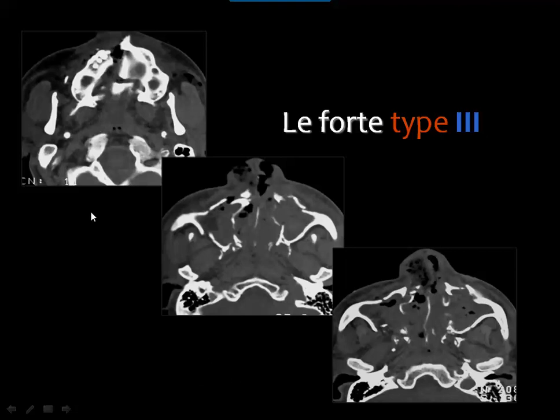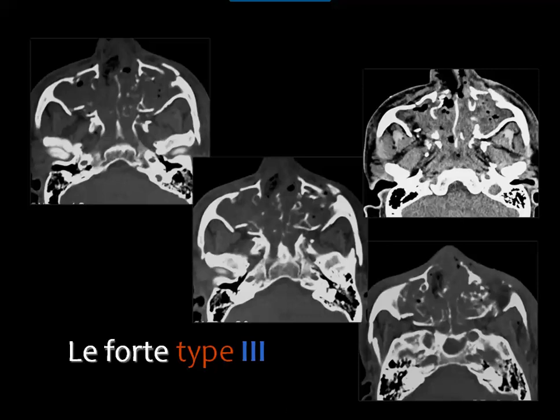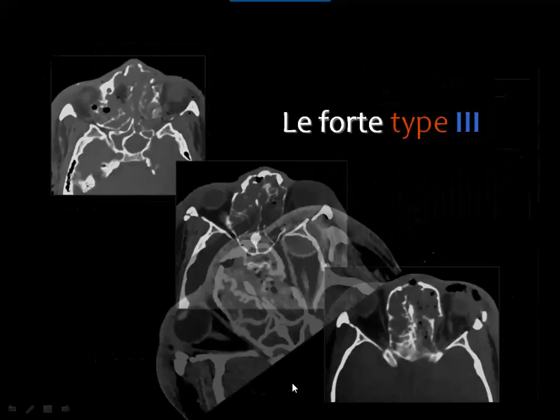And here, comminution of the alveolar margin and the hard palate, comminution of the medial parts of the maxillary sinuses, the bony nasal septum, separation of the zygoma bilaterally, and comminution of the medial wall, comminution of the pterygoid blades, comminution of the ethmoidal air cells, and you see also fractures of the zygomatic arches. And you can see here the soft tissue window images will show hemorrhage, extensive hemorrhage in the sinuses and in the nasal fossa as well.